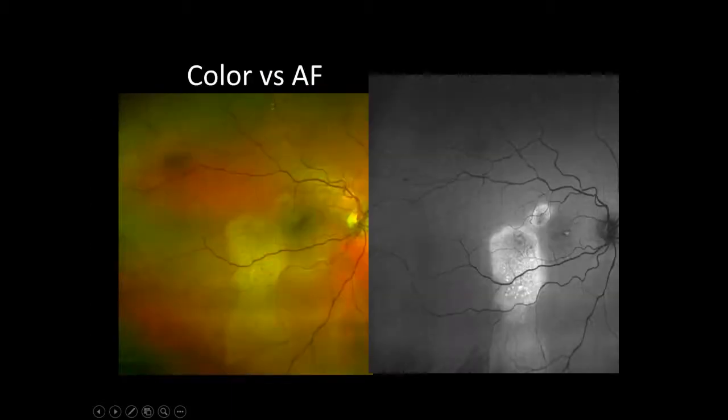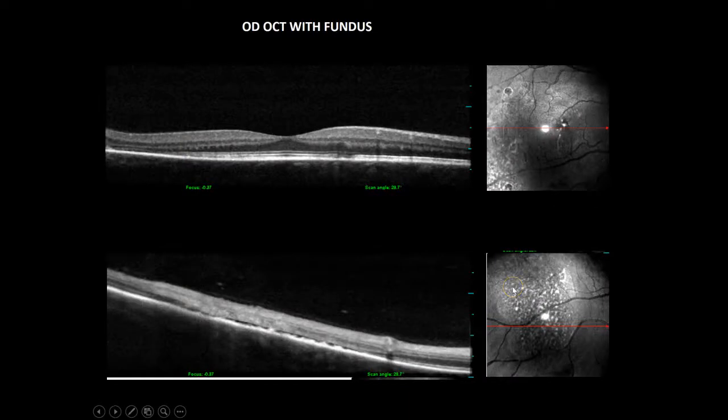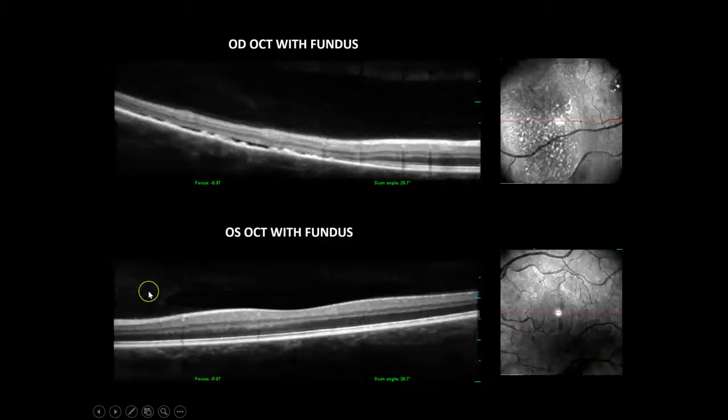Central serous can be a unilateral condition, or often bilateral, but very often asymmetric. Again, he has good acuity, 20/15. What's most significant is this lesion here, which is temporal and inferior. We can do OCTs through it and show some of the abnormalities, some of the separations are shown here, some retinal precipitates are shown here. Here's a space that we can see. And also similar abnormalities here.